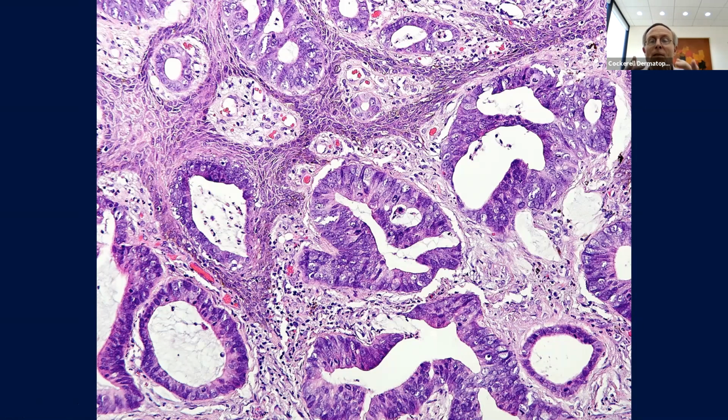And when you see this morphology of adenocarcinoma, I don't think the board is going to ask you too many questions about general pathology stuff. For those of you that are going to go on to dermatopathology someday, well, yeah, maybe you'll get something like this. But if they're going to show you something that's in the realm of general pathology that interfaces with dermatology, it's going to be pretty obvious, like breast cancer. We've all learned about the single cell spread of metastatic breast cancer. So they're going to expect you to know that, the Indian file type pattern, that sort of thing.